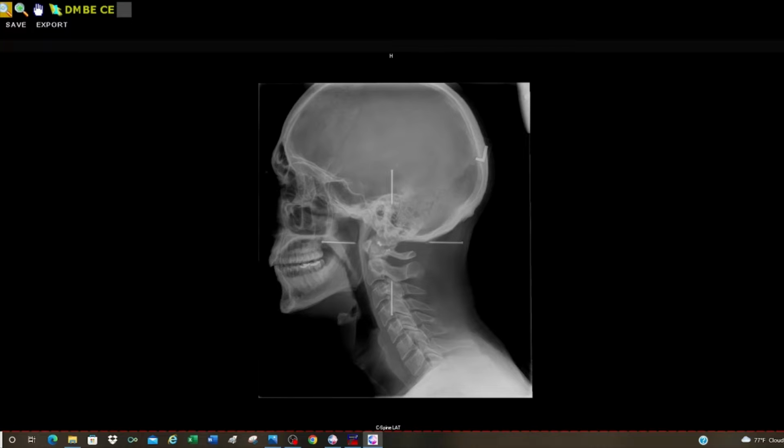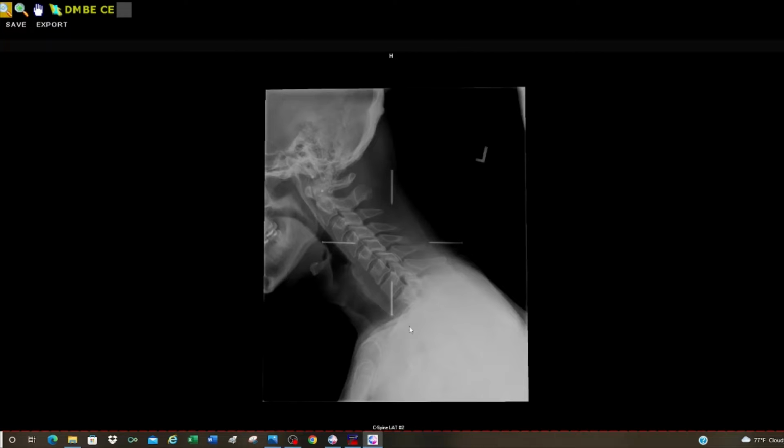So our next picture is a flexion film. When a patient flexes down, the spine should be a nice rolling curve, should make an inverse curvature, and all these little tails, what we call spinous processes, should flare open nice and evenly. In fact, the most amount of motion should occur right here at C5 and C6. Unfortunately, what we see here is C2, 3, 4, 5. C5 is super stuck to C6. That is our primary issue.